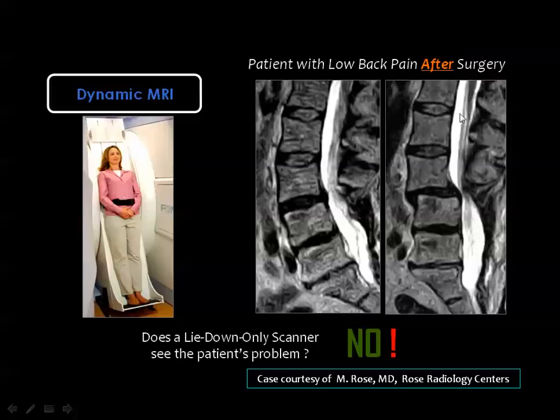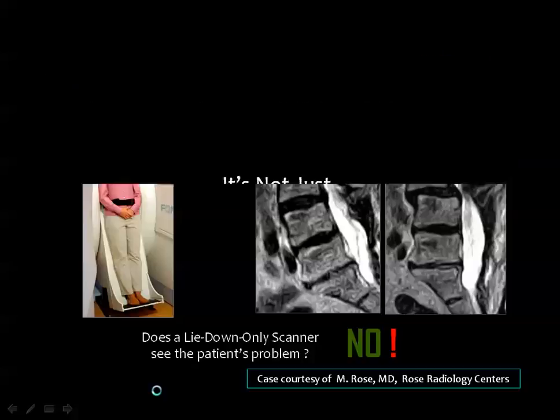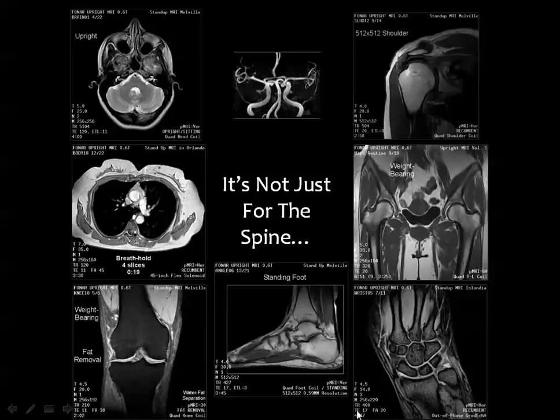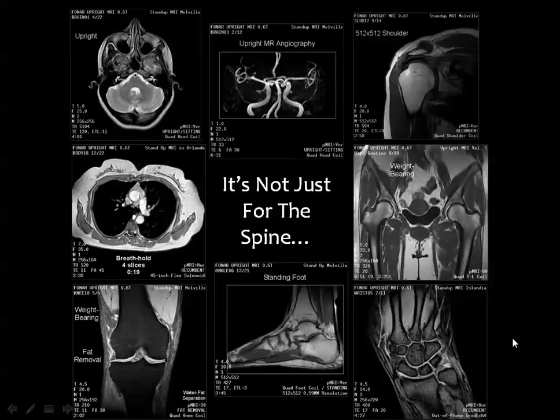But if you examine the patient in the upright position with axial load on the spine, then you can see evident spinal instability as in this example, and you can appreciate marked narrowing of the spinal canal while the patient is in the erect position. This machine, as I have said before, is no more just for the spine, but it can examine all parts of the body using the different surface coils.